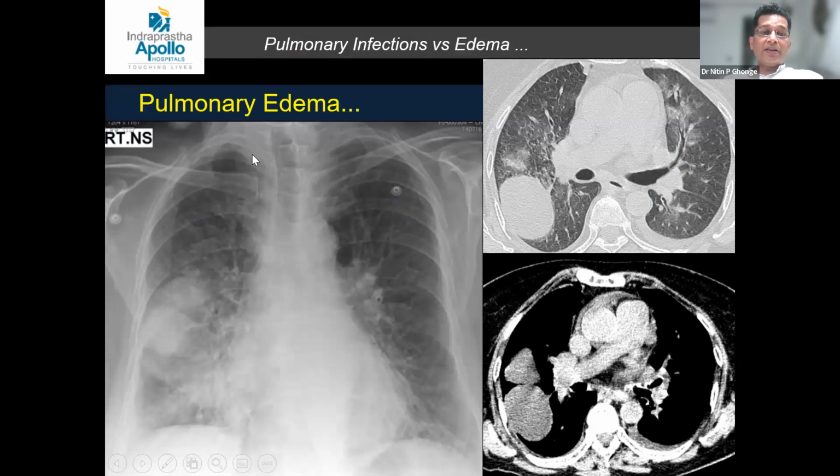Common complications in CKD patients include pulmonary edema. As I mentioned, you can see more vessels in the upper part, almost the same as the lower lobe. Then we can see focal fluid in the major and minor fissure on the right side. These are the focal fluid. These are pseudo tumors, not true tumors. These are pseudo tumors in the minor and major fissure.